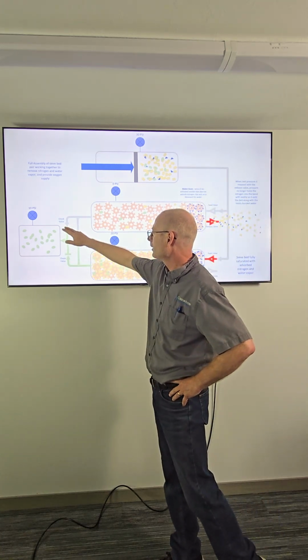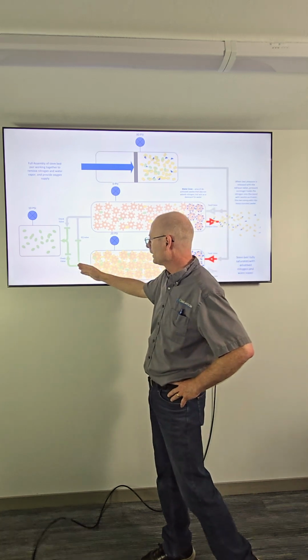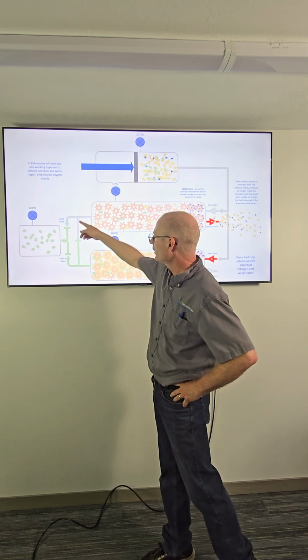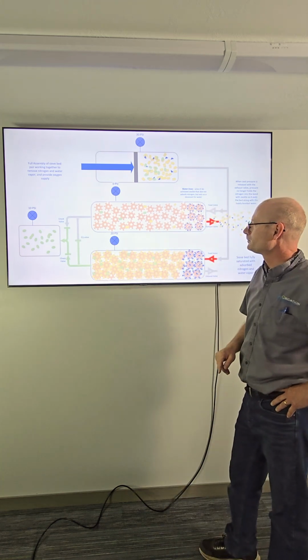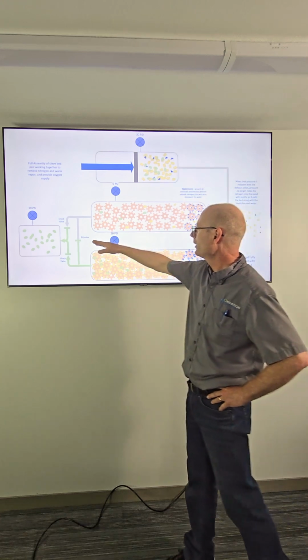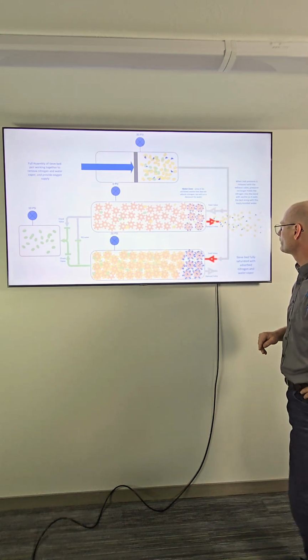And we've also put a couple of valves here. We've got some check valves so that the oxygen can flow this way, but it's not going to come back. We also have something called an EQ valve. I'll talk about that in the next slide. When we open that, that's going to allow some oxygen from one to the other.